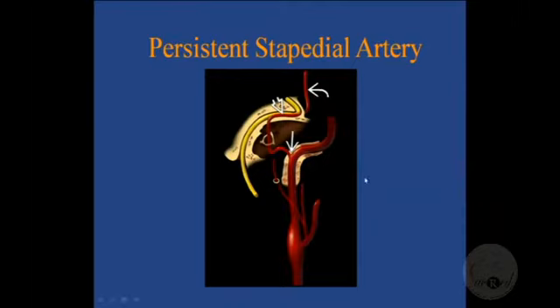To orient you, this is the left temporal bone. That's the common carotid artery, a coronal view, common carotid artery, then external carotid bulb, internal carotid. It enters the skull base, that's the temporal bone here, dissected out. The internal carotid gets into the temporal bone, takes the first bend. Normally, there should not be any branches from that area. If there's a branch, that most probably is a stapedial artery, and it takes off. The stapedial arteries are present before birth and then involute.